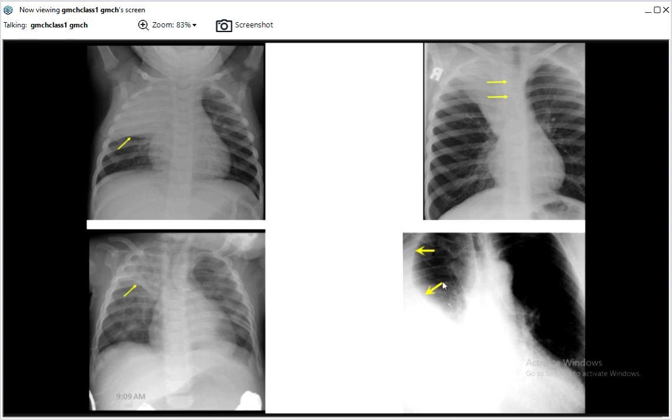Here in this X-ray, what you see is a radio opacity. This is not a complete X-ray, it is cut. So this is basically a pleural effusion. This is the radio opaque shadow going up to the costophrenic angles. The trachea should normally be slightly to the right, but it is going slightly to the opposite side. So there must be some fluid collection here.